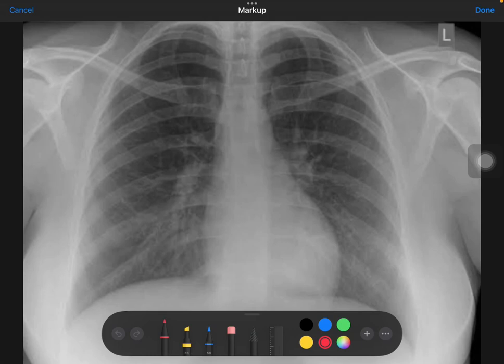Hello everyone, I am here in this video to explain the important structures. When you get a chest X-ray PA view, we should start looking at the X-ray from the outside to inwards, from both sides, the right and the left side. Why do we do this?